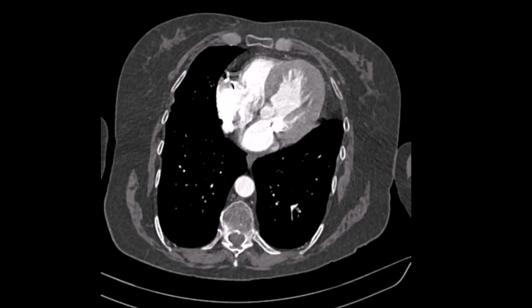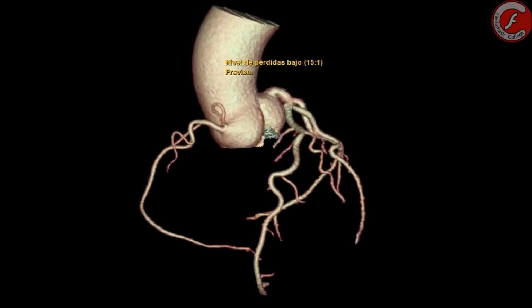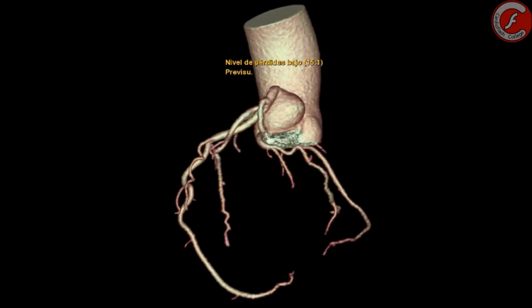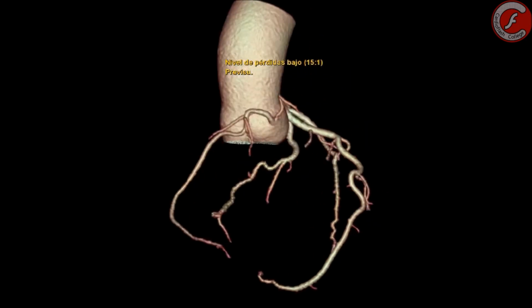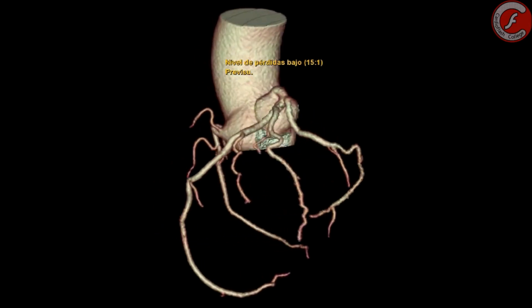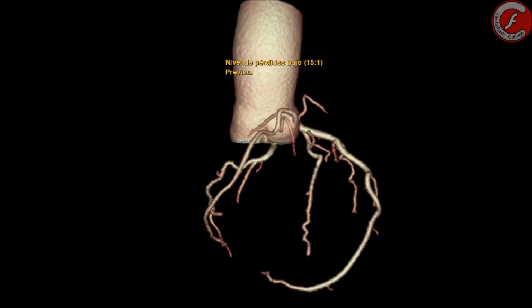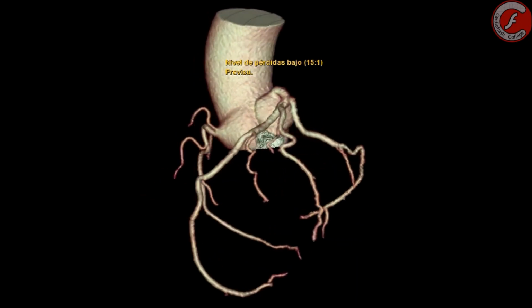Number 4. Chest pain is a common symptom in patients with hypertrophic cardiomyopathy. The mechanism that has been associated with this symptom is microvascular ischemia. However, it is necessary to rule out atherosclerosis of the epicardial coronary arteries. Furthermore, intramyocardial coronary tracts are not uncommon in patients with hypertrophic cardiomyopathy and may be the cause of pain. For these reasons, and taking into account the high negative predictive value of cardiac CT, the coronary scan could be considered the technique of choice when ruling out coronary disease in patients with hypertrophic cardiomyopathy.